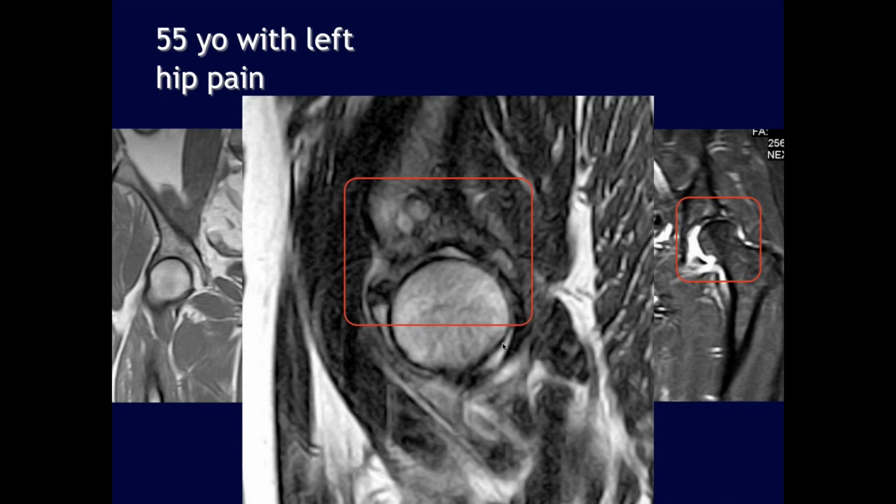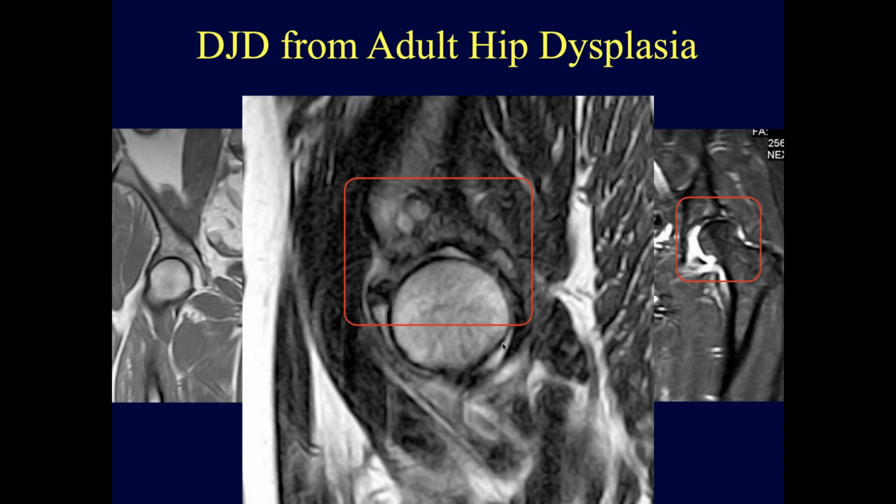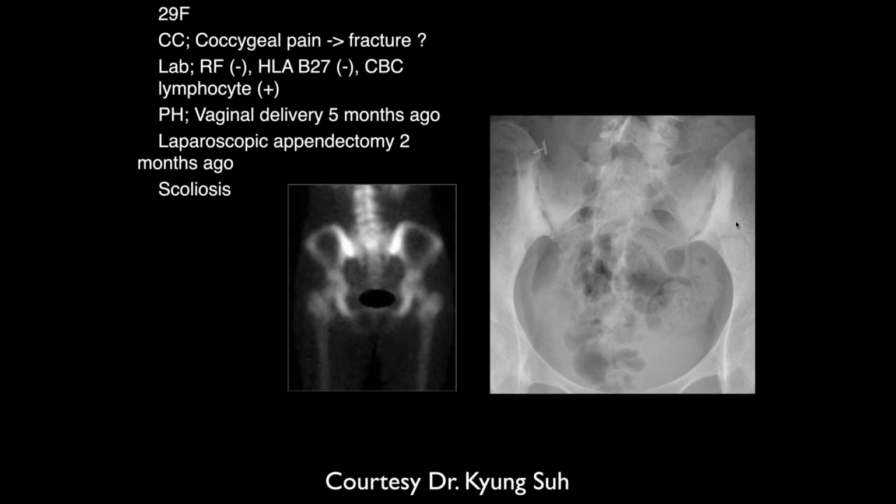Is that acetabulum dysplastic, like mild dysplasia and then degenerative changes? There you go. Yep. Yeah, this had some abnormal center edge angle. This was dysplastic and then had secondary degenerative disease as the patient got older. Right. Okay. Jennifer. Large joint effusion. Yep.